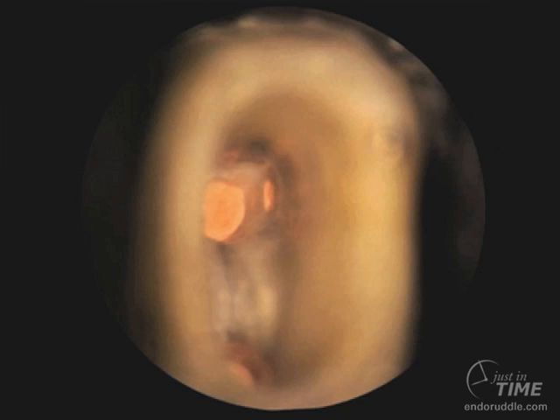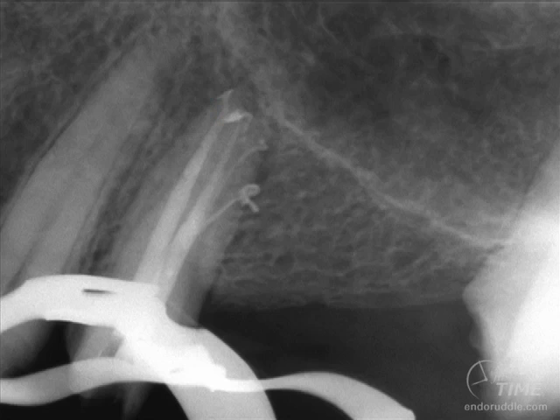If we go to the radiograph, you're going to see it's a rope of gutta percha that's been compacted into that lateral branch. And in fact, if you look at this post-op film, you can see this abutment's going to be tied up in an extensive splint, and isn't it neat to see all the portals of exit sealed?